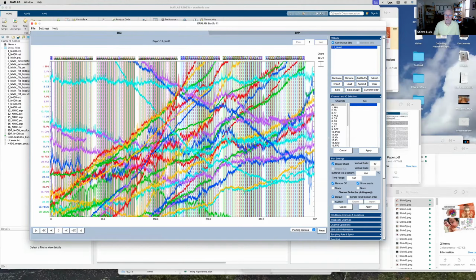And so we have all these slow drifts, okay? If you're not doing high-pass filtering, you have slow drifts in your data. And I encourage you to look at your data at like 5 minutes at a time. You'll realize stuff is going on that you did not realize if you're looking at just a few seconds at a time. Okay, so let's go back to our 5 seconds.